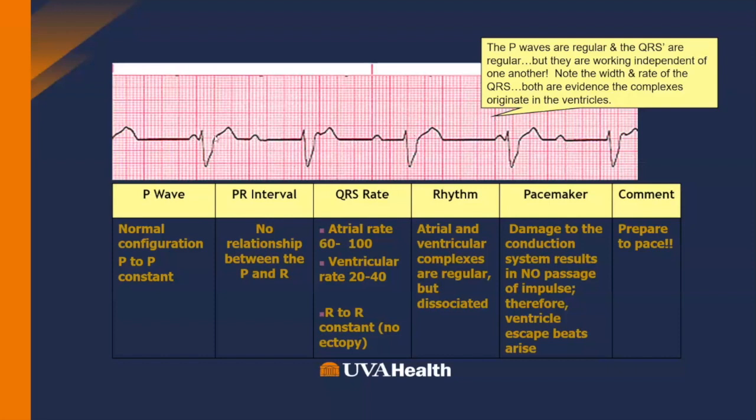And when you get to the finer points of this, you'll even appreciate that this P wave cannot conduct this R wave because the PR interval has to be of a finite period of time, because we know it can only travel that SA AV node pathway in a certain period of time. And so when you have a PR interval that's very, very small, chances are that this did not conduct this beat. That's kind of difficult to understand. We've got a lot of other ways to tell that this is complete heart block.